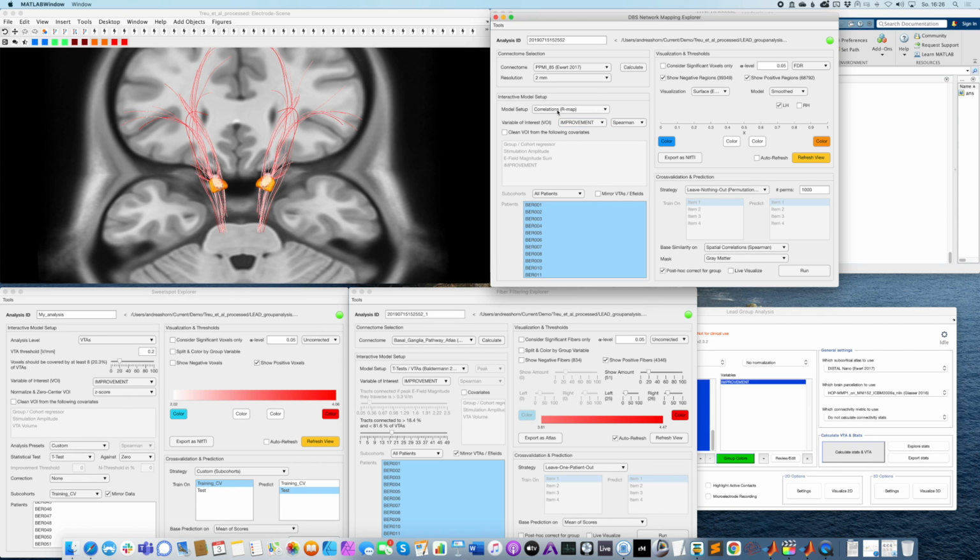Since we have selected correlations currently, we can again state which type of correlation we want to use. This is structural data, so in my view, Spearman correlation is a good call. If it's a functional connectome, then Pearson correlation is also fine. We can assume quasi-Gaussianity in that. Bend correlation and Spearman correlation are more robust, so you can also use those.